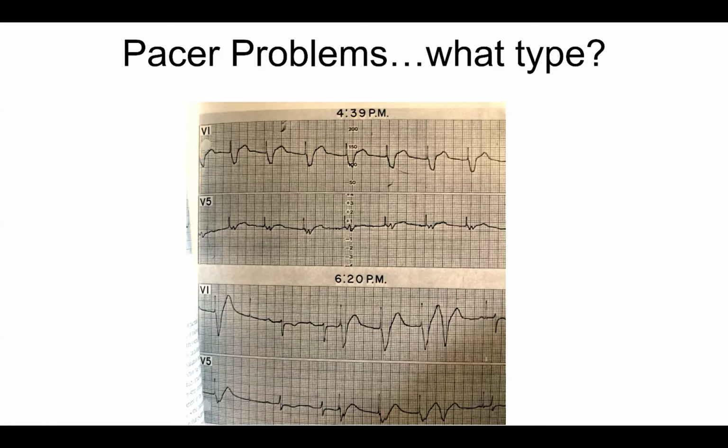That the threshold is low. Actually, the threshold is out high, right? Something's wrong with the ability of the pacemaker to consistently capture, right? Because a pacing spike this long after the prior QRS should have captured, right? So there's some problem with ventricular capture. The fact that it captured here and doesn't capture here suggests maybe the pacemaker's threshold has risen.